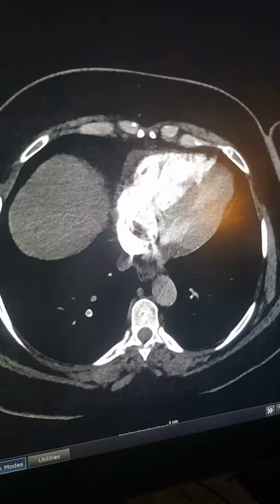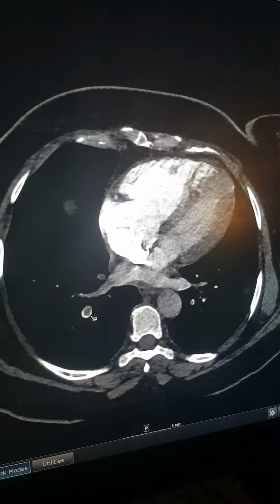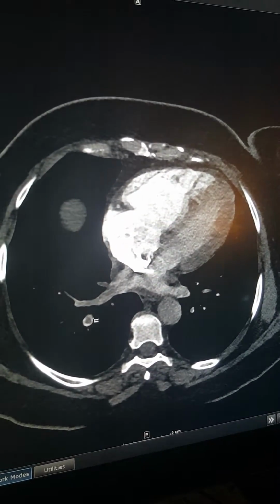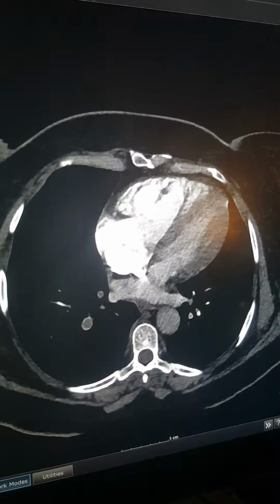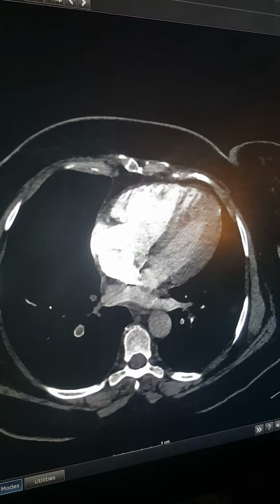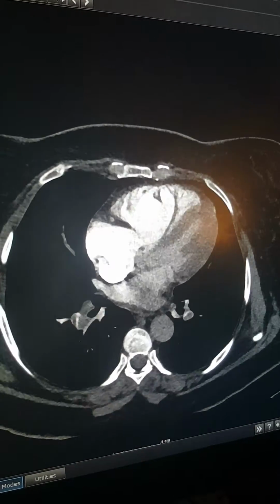It gives you a good radiological sign, the donut sign. So we can see here the central filling defect with the peripheral contrast going through. That means this vessel is trying to save itself from this filling defect and trying to perfuse the lung.